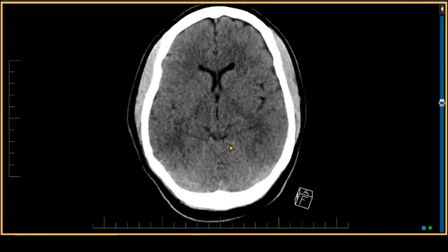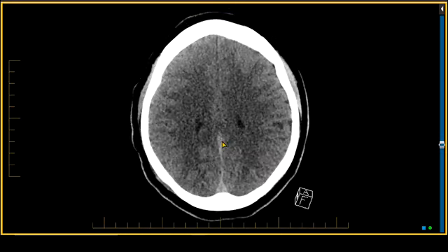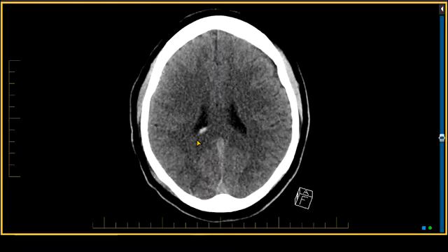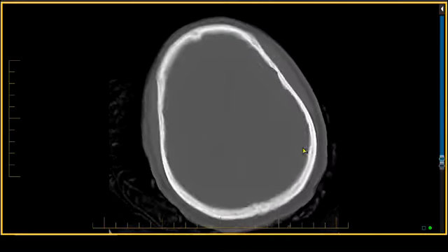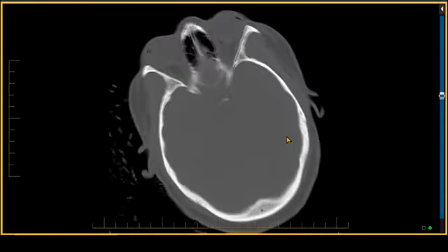But the next thing one sees in a flash going by is some hyperdensity along the top of the corpus callosum, and maybe a little bit of blood that's collecting in the lateral ventricles. We look at the patient's calvarium, see that there are no fractures.